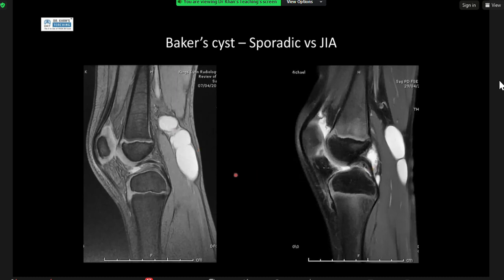And 2 different patients, and you can see that on this one, you've got synovial thickening. On MR, on T2, synovium is these low signal frond-like bits that coat the joint capsule, the joint space, and that's basically an inflammatory process driving this Baker cyst production, versus one that has mostly joint fluid within the Baker cyst, but none really in the joint space, and no evidence of synovitis. So this is just to let you know that if you do have a Baker cyst, although it's reported, just make sure that there's nothing else underlying that's driving it.